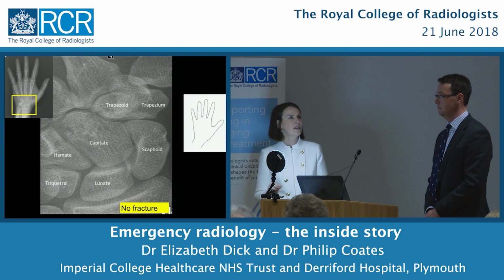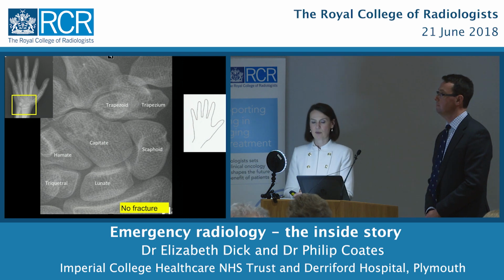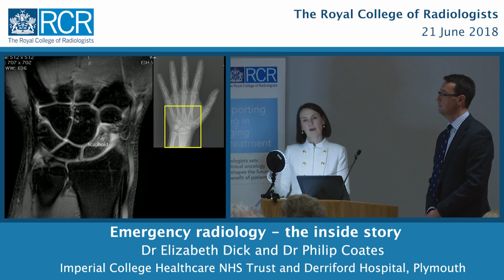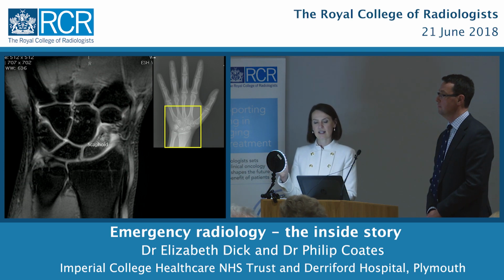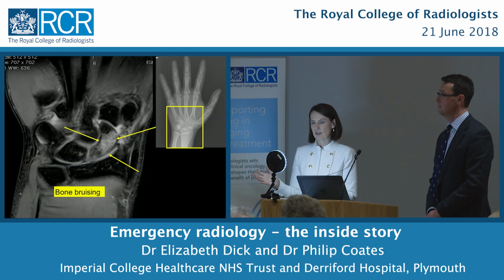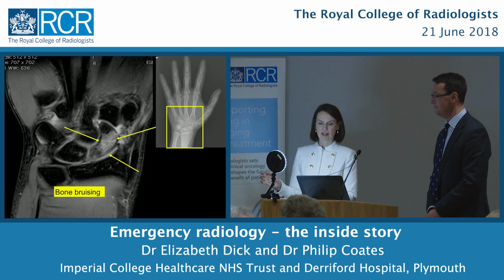Now, luckily, we happen to have MRI available, so we did an MRI on this patient. And here we've got the scaphoid bone. And what's happened with the MRI is that everything that is bright is fluid and bruised. So you can see that the scaphoid is bright, and that is bone bruising. So there's definitely been an injury to the scaphoid, no doubt about it. But what really matters is, is there a fracture or not?